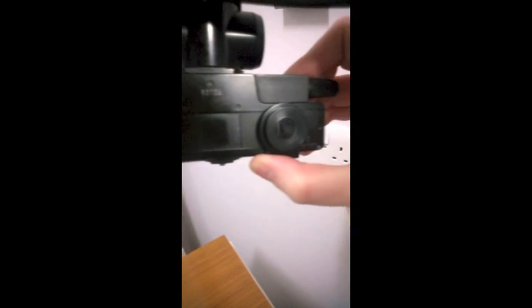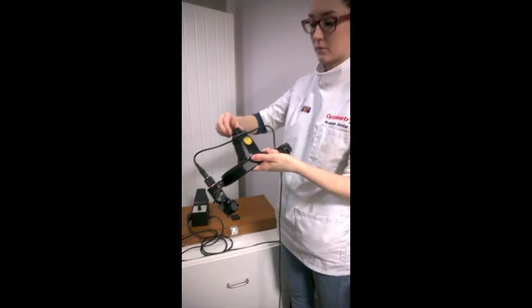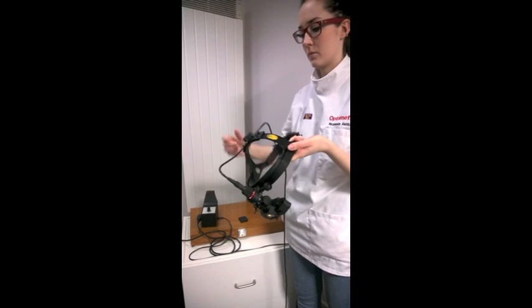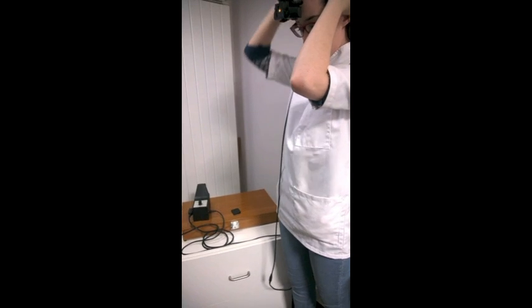In a similar way, we can also adjust the aperture size. The smallest aperture can be used for undilated pupils, but the largest aperture is best for dilated pupils. The pupillary distance can be adjusted using the sliders shown here. The headband can be adjusted with two knobs, one at the top and one at the back. Once in place, you must ensure that the eyepieces are properly level with the eyes.